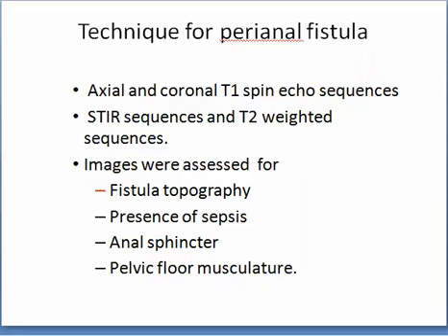What about the technique for perianal fistula? We do axial and coronal T1. We do STIR and T2 weighted images, axial and coronal. Images will assist for the topography, sepsis, anal sphincters, and pelvis or pelvic floor muscles.